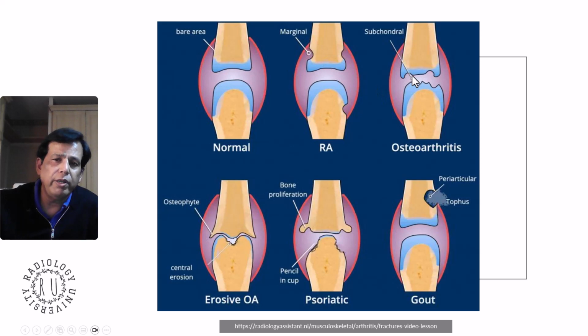This is subchondral. This is a loss of joint space. Something happened to the joint margin, which is destroying it, or it is traumatic, or there is loss of joint space due to mechanical conditions. You can get chondral and subchondral changes. Chondral is cartilage; subchondral is below the chondral. Initially the changes are chondral, then they lead to subchondral. On MRI it could be chondral, but on X-rays it is mainly subchondral. This is seen in osteoarthritis normally, and the marginal erosions are seen in RA.